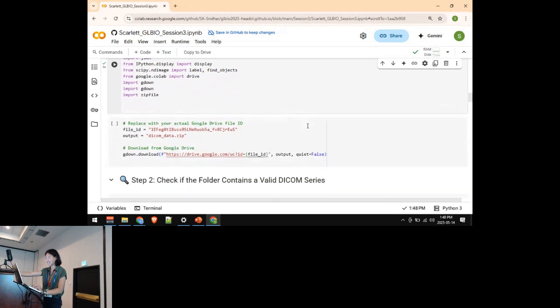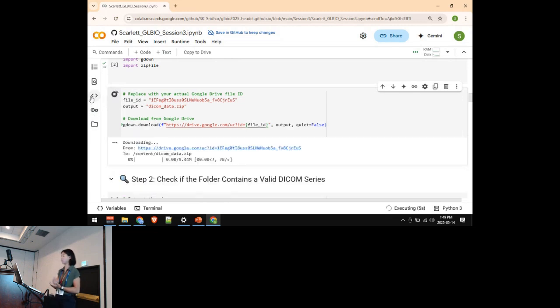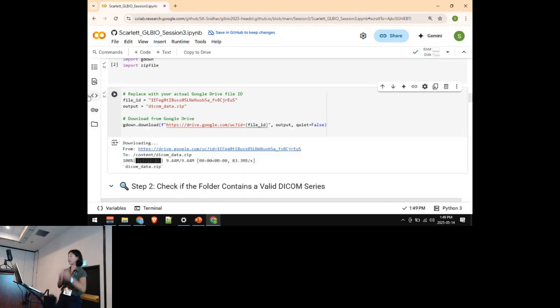Thank you. So after you load the file, I have included the raw DICOM data over here in my Google Drive. So all you have to do is click the play button, and then the raw data will be downloaded. This is a DICOM file. I want to guide you through today from downloading a DICOM file, having a whole stack of DICOM, and then converting it to NIfTI and manipulating the data from a NIfTI format.